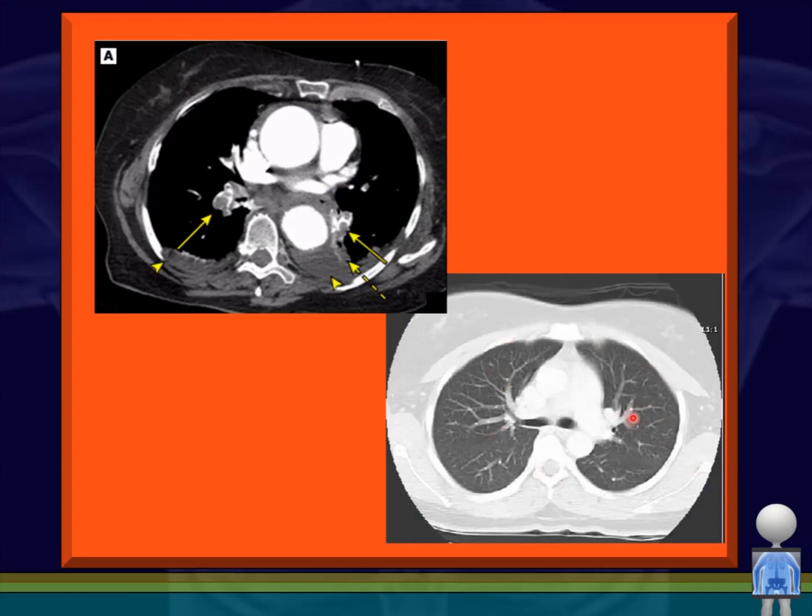Again, when you see those little circles, see that little circle, and this little circle, and that little circle, that's when a vessel is being transected in this case by the spiral CT machine, right? So it's being transected, and that's just a transection of a vessel. But here, look, we're missing what we should have, and in this case, you can actually see the emboli sometimes in the actual CAT scan. This is a bilateral, this is not a good situation.